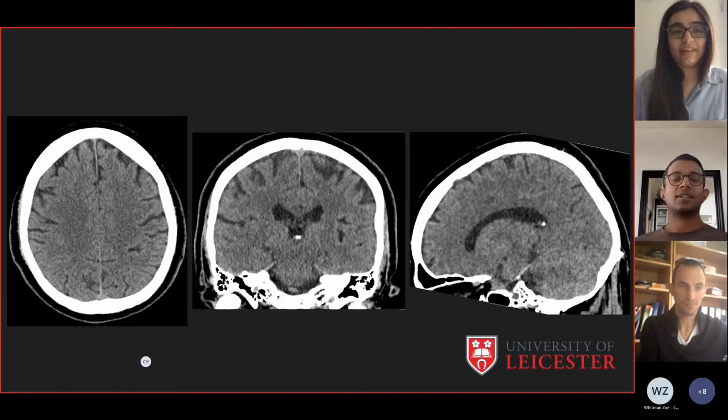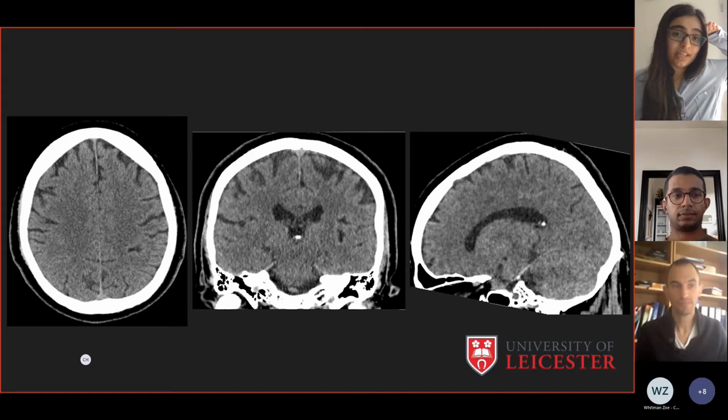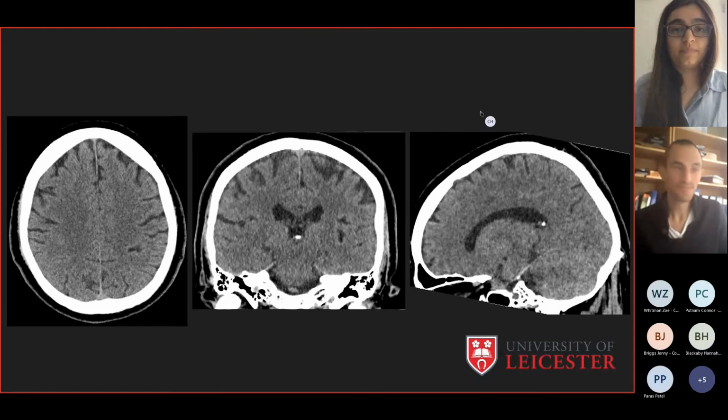All right, so if we start with the first picture, which is on the far left on the screen, it's taken horizontally through the brain. So we're just taking a slice like this. Anyone want to shout out the name for a horizontal slice? You guys feel free to unmute yourselves and to chip in. It's supposed to be an interactive session. Join in, people. Sounds like a trainee question to me.